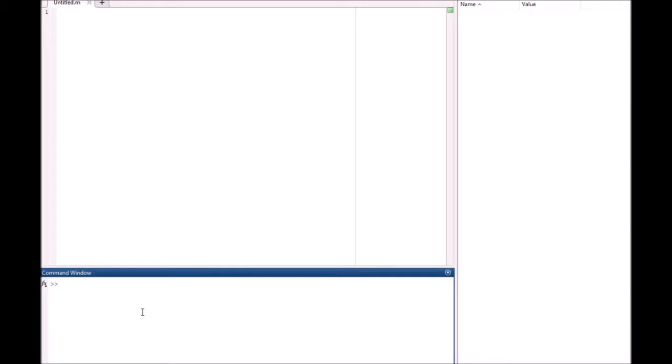I'm using some pre-processed EKG data, 2 channels of it, pulling it in from a .mat file, so it's already converted. Normally, when you get EKG data, if you're doing it live, you'd have to stream it into Matlab. I'm using Matlab here. If you're using pre-recorded data, usually you have to convert it from a comma-separated value CSV file or any number of other file types.